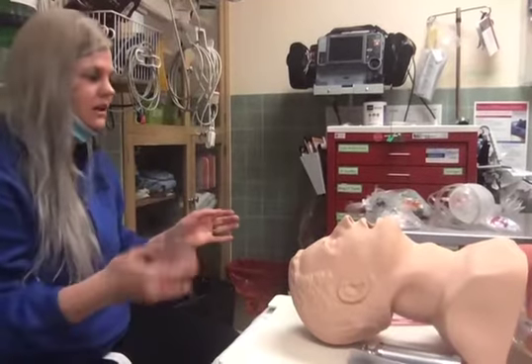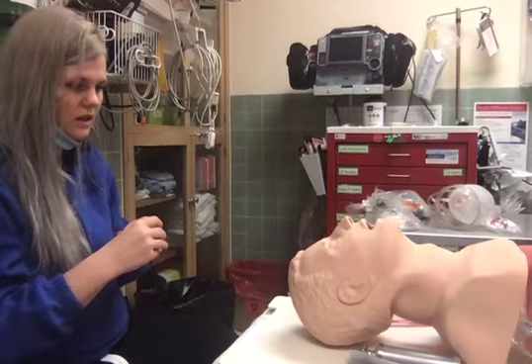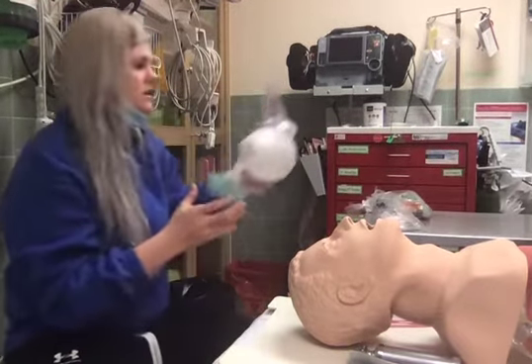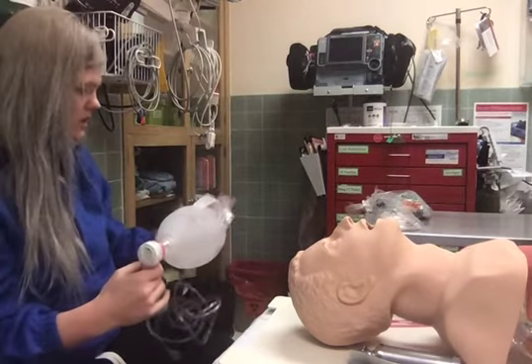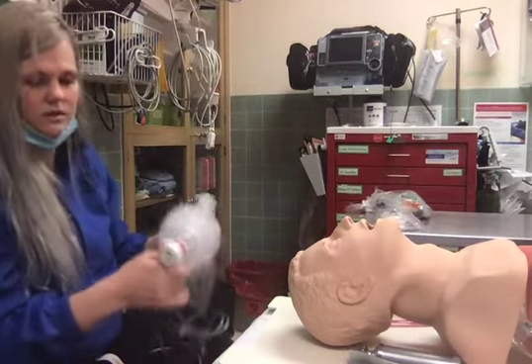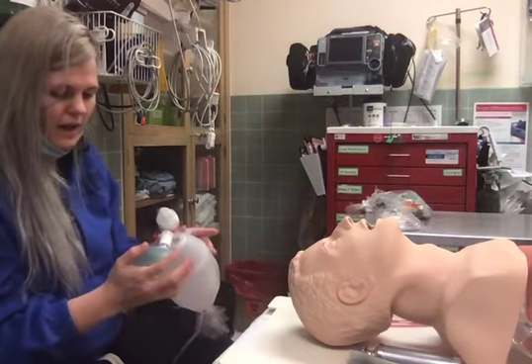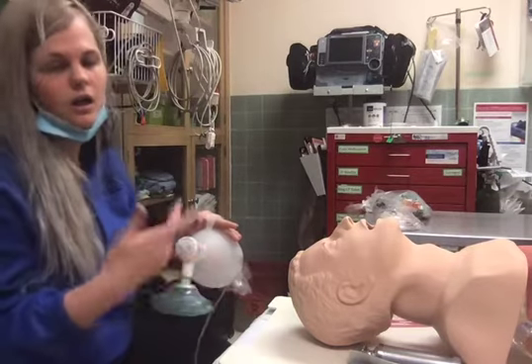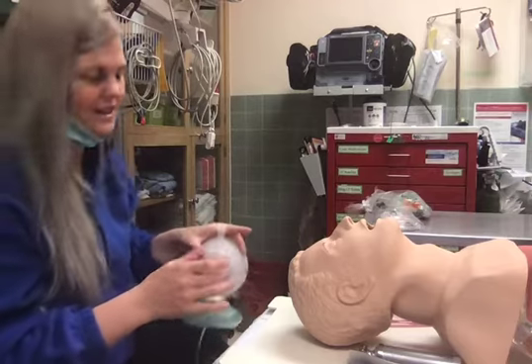So as we have kind of gone through some of the equipment portions of the airway ladder, I kind of feel like this is for when things go wrong. This is the tool that a lot of people underestimate as far as its usefulness. In my mind, this is a BLS ventilator. And so you have your mask, of course, if they're not intubated or you don't have your King tube or Combitube or the LMAs, or the 10 things you can hook up to these.